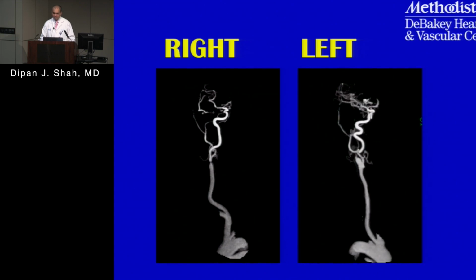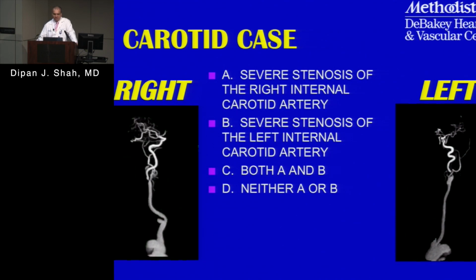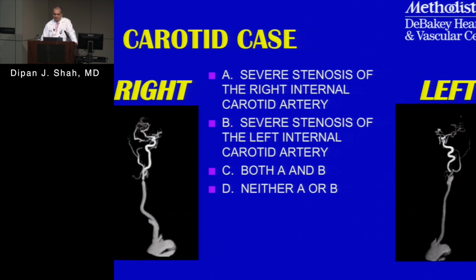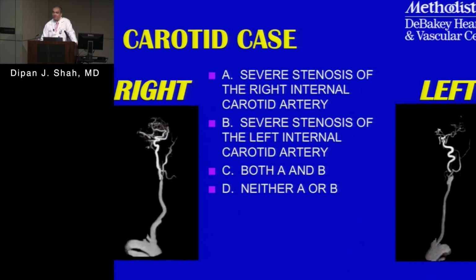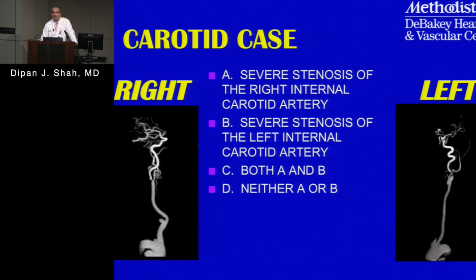And so the question is, how many of you think we have now severe stenosis of just the right carotid? Raise your hand. Okay, severe stenosis of just the left carotid, raise your hand. Okay, bilateral carotid artery stenosis, raise your hand. Okay, and who says neither? Mawash. Why do you say neither, Mawash?